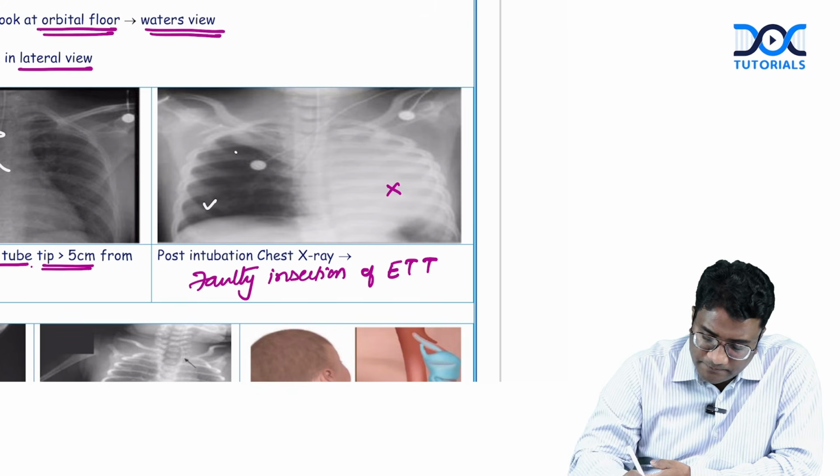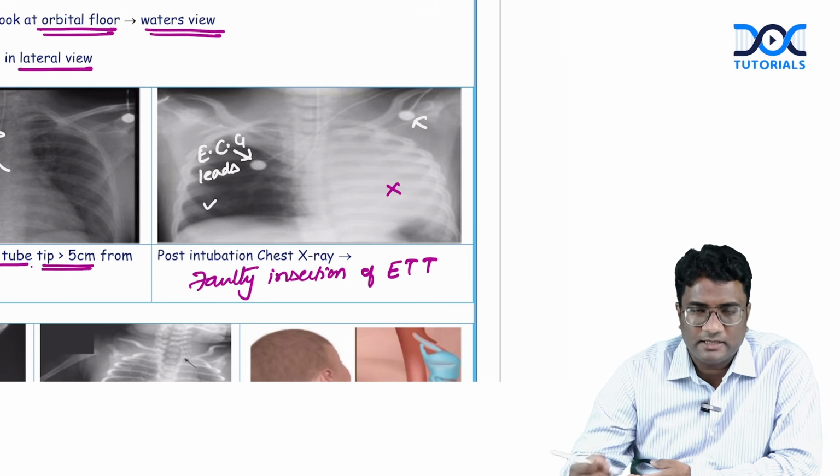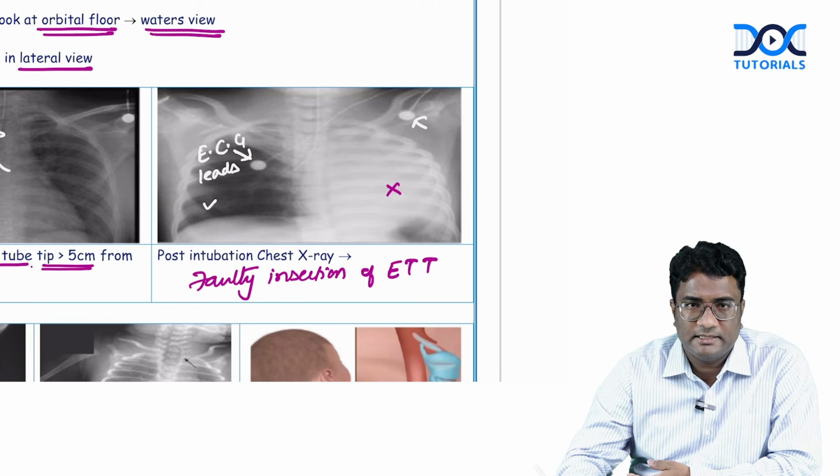And what do you see here? These are your ECG leads. Don't consider them to be foreign bodies, okay? These are just ECG leads that you have.